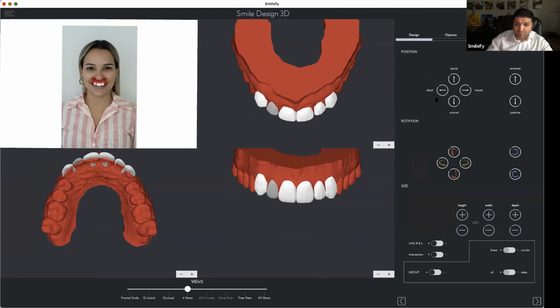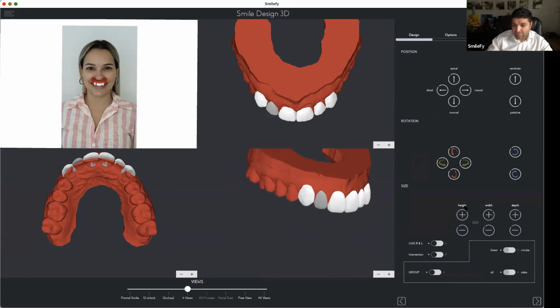Of course, everything I show you right now is a prototype. In June, we are going to release this 3D feature. Until then, we are going to calibrate the templates, the calculation, everything, better.